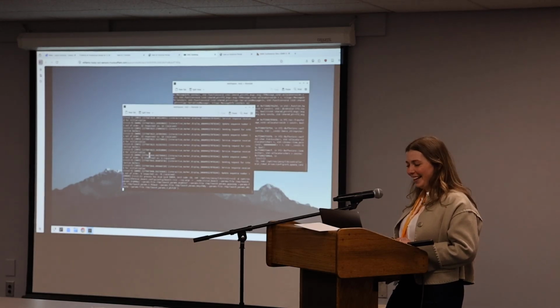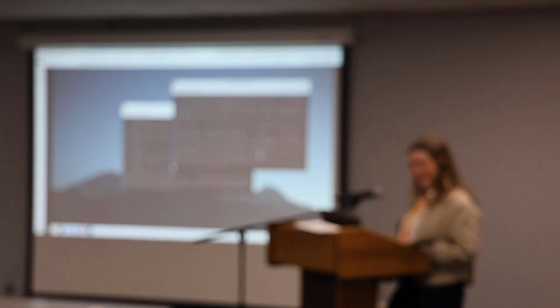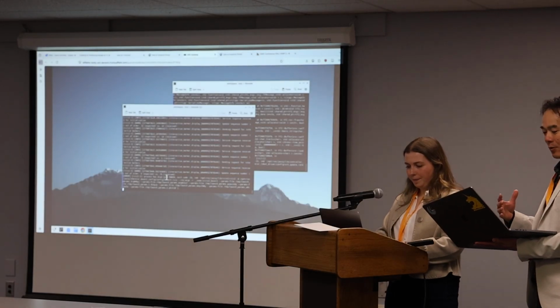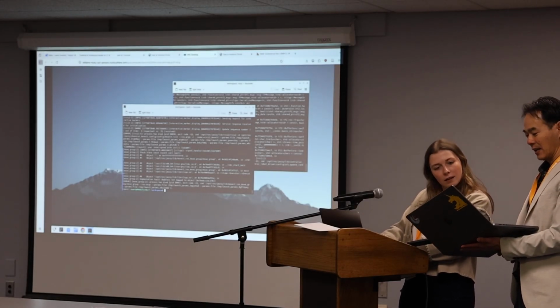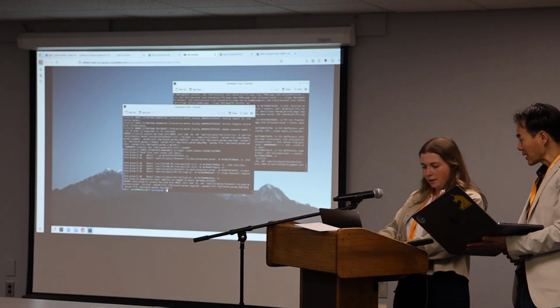Maybe we could try this. This is what I found, a good test. There's an environment variable that will limit the communication within the local host, the ROS domain ID. So it has to be a unique ID. Do I just set ROS domain ID? Export, I think.